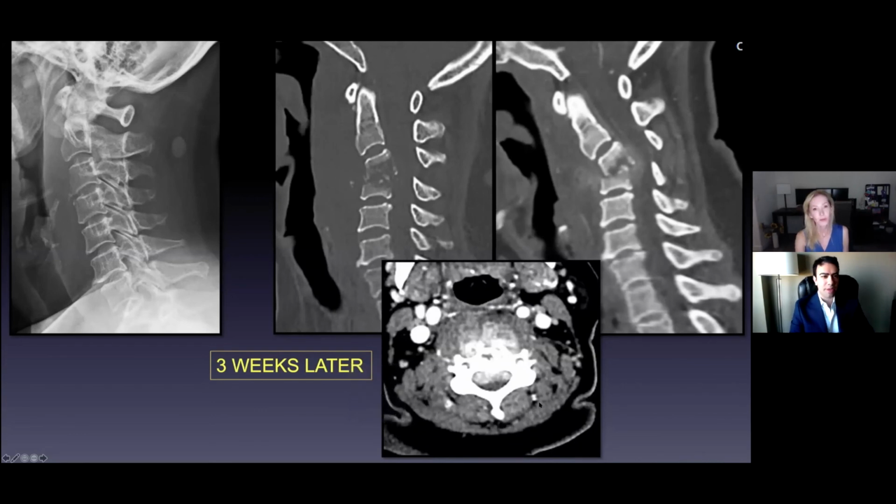Ultimately, this is a patient who definitely needs neurosurgical care. So let's look at it. You literally hit all the points, nails on the head, in terms of all the detailed aspects of this patient's imaging. Let me talk a little more about how I look at this in terms of surgical planning and some of the clinical characteristics.